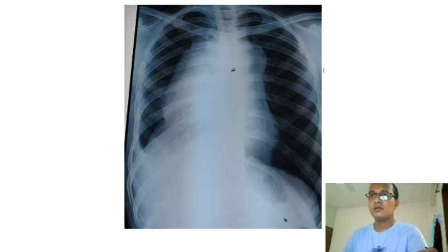Dear audience or dear learner, at first you will try yourself to describe the X-ray on the screen by pausing the video within 20 seconds. Remember, in our academic station in the exam hall, to decide the diagnosis of an X-ray or ECG, you will get a maximum of 20 seconds.